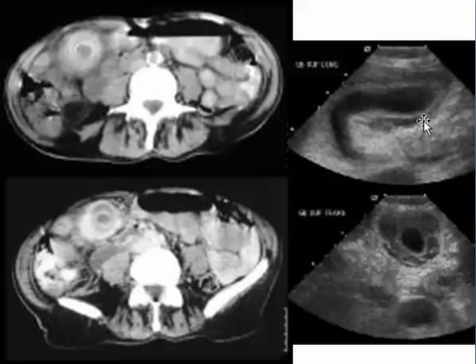So the inflammatory process causes this hypoechoic area, and it is too thick for fluid only. This is heterogeneous, denoting inflammatory changes. Cholecystitis with pericholecystic abscess.